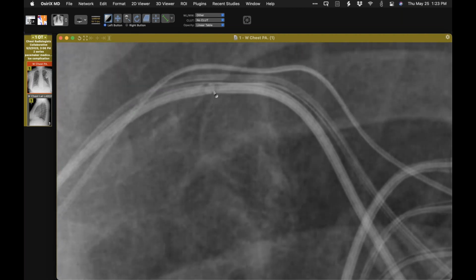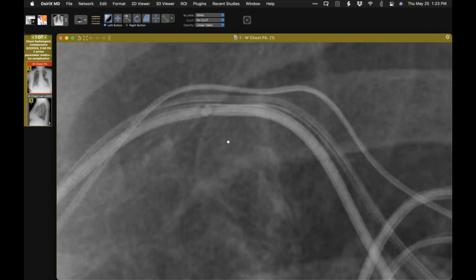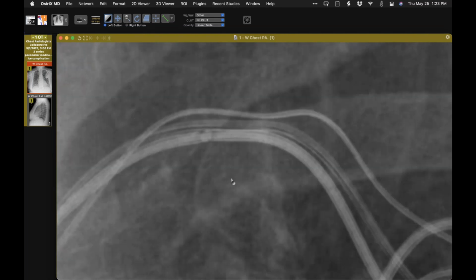there's discontinuity. I can't see a frank fracture of that pacemaker electrode, but when they examined this patient, they got substantially abnormal impedance related to the atrial lead, which they subsequently replaced. And I think it is at least disrupted enough here to produce that. So that's the place to zoom in really carefully, because otherwise it looks like the insulation maybe failed there.